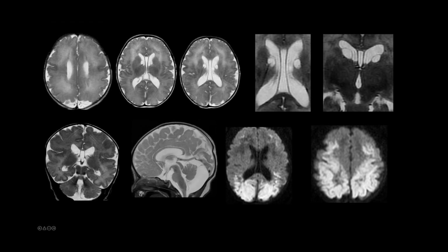So there is perisylvian polymicrogyria, subependymal cysts along the bilateral lateral ventricles, some abnormal white matter changes in the cerebral white matter. In a zoomed in picture, you can better appreciate the subependymal cysts. The coronals again better appreciate the polymicrogyric appearance. There's also hypoplasia of the cerebellum. The brainstem also demonstrates a slightly hypoplastic appearance.